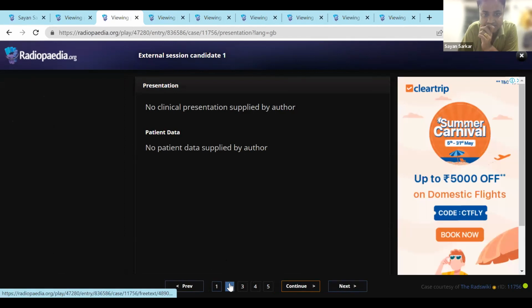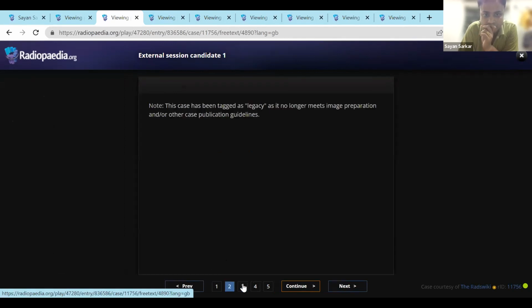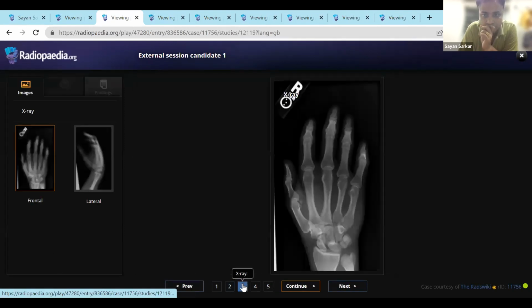There is no history. Okay. You cannot see the lateral. Okay, you have to comment on the frontal only.